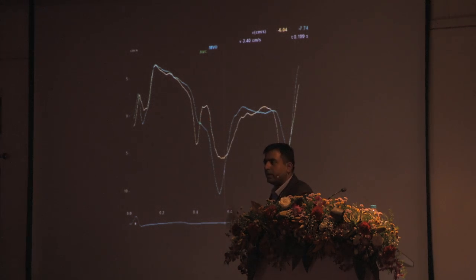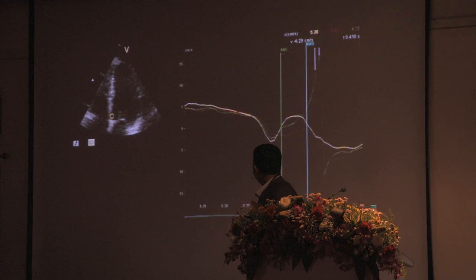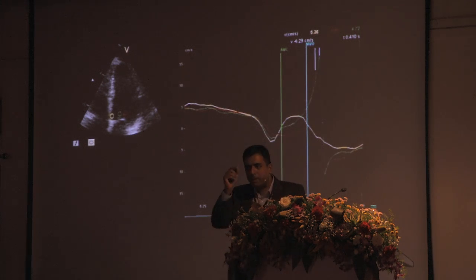So where does the mitral valve open? That is the question. The opening and closure of the mitral valve are some of the most complex and most debated topics of cardiac mechanics, and everybody has 10 different reasons why the mitral valve closes and opens. Now, how do we find out where the mitral valve opens? We can do that very easily visually. Because we are doing it in the apical views, we can see the valve opening and closing. But we need to pinpoint exactly.